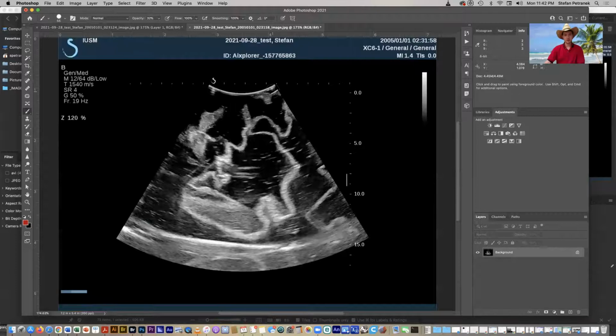But now you can see that we actually have a very different quality. So if I wanted to, I could use this to color in part of this whole picture. And there's opacity to it, but there are some complications with using it, which you can see. If I have overlap, then that's going to add into the opacity. Also notice that I'm doing this right on top of the actual image layer.